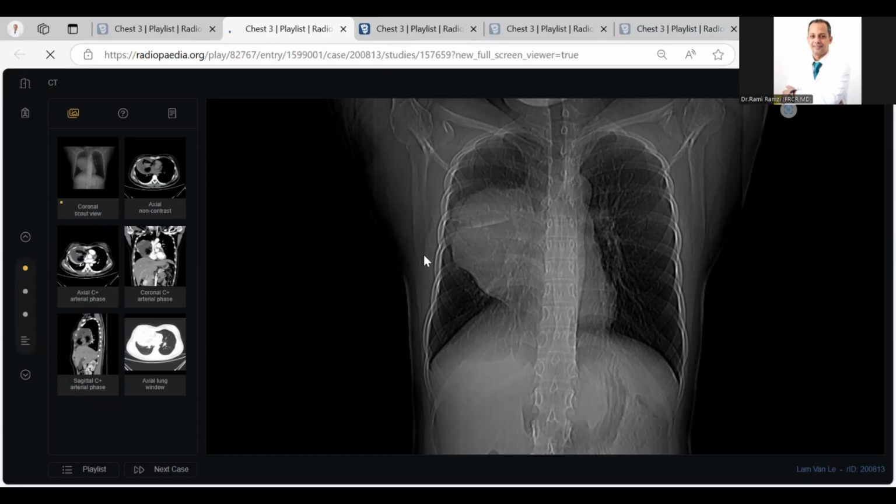All right. I am presented with a scanogram of a patient who presented with dyspnea, 40 years old. I can see there is a lobulated mass lesion in the mediastinum. It has lobulated margins laterally, which are sharp and well defined with the lung. There is loss of the right cardiac border, which signifies the mass is in the anterior mediastinum. However, there is no mass effect on the trachea. Trachea is central in position. What's your differential diagnosis?